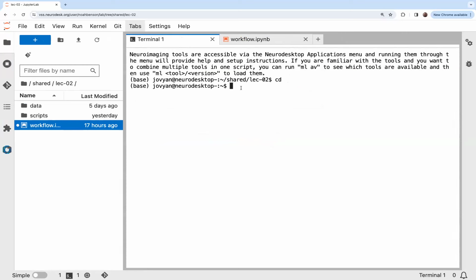All right, so we're going to start by typing a command. It's going to go like this: PATH in capital letters, please type it exactly as I do, equals, and then in quotes, $PATH, colon, /home/jovyan. Jovyan is the username that you always have when you're using NeuroDesk.